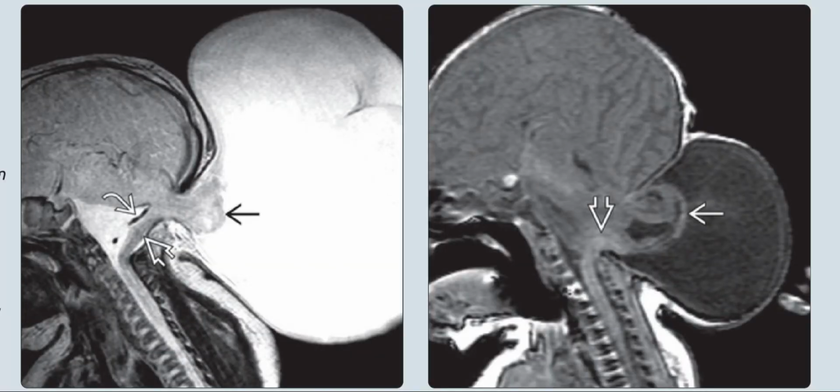Now, coming towards the Chiari-3 malformation cases. The image on the left is the sagittal T2-weighted MRI, and it reveals a large defect in the ventral chondral portion of the supraoccipital bone and the opisthion of the foramen magnum. The gliotic cerebellar tissue is protruding into a large sac. Also note the displacement of the brainstem and basilar artery.